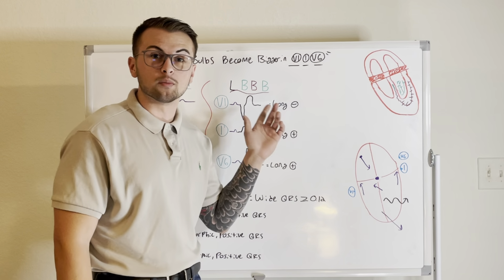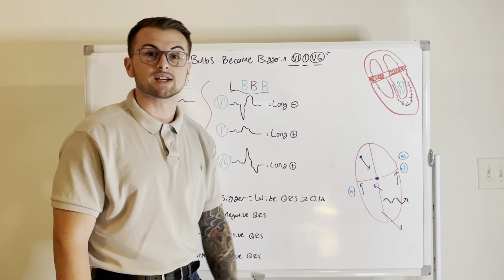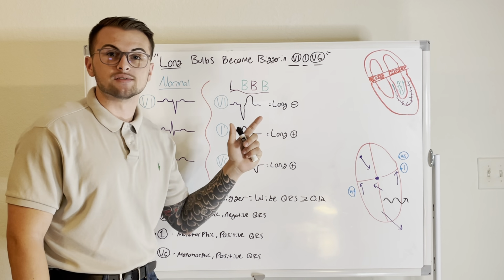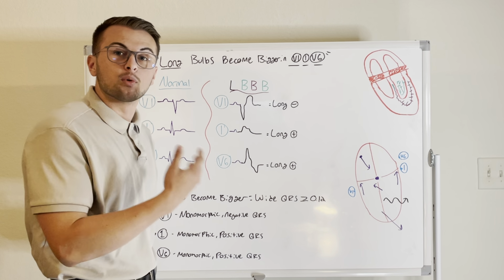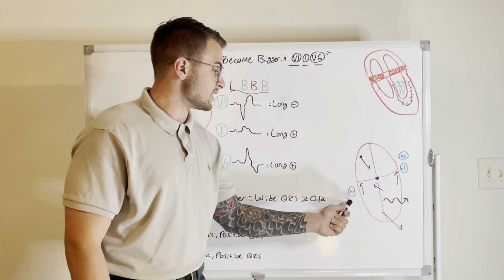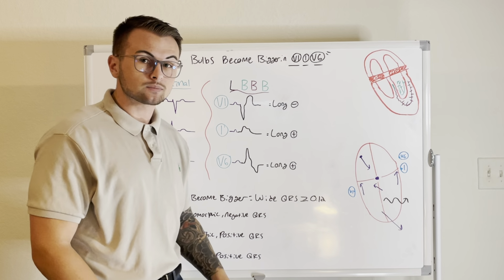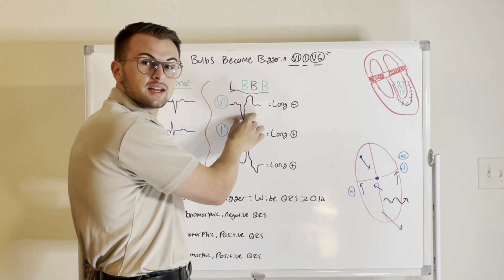Well, we'll see these bulbous looking QRS complexes, but where do we see it? Well, we have to look at V1, 1, and V6. So in lead V1, we will have these small R waves with sort of deep and wide S waves, which sort of look like complexes in VTAC if we were to string them all together. The important thing to remember here is that when looking at V1, because the depolarization vector is headed away from V1, then these will appear mostly negative. It'll have more negative than positive. So we know that we'll have a long negative looking bulbous complex in V1.